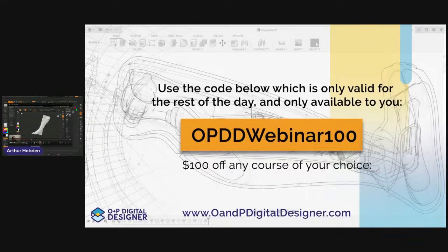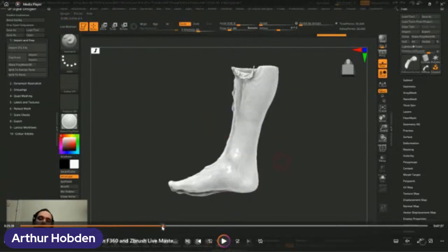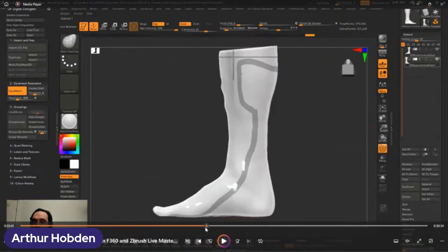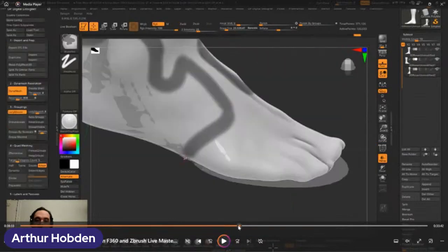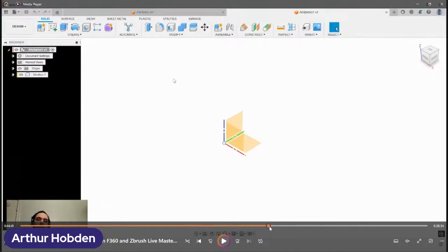Left before. So I'm going to go back to ZBrush. Just again, to recap what we had done last week. Last week we did some scan cleaning from an uncorrected, unaligned scan. We modified the topology and we got ourselves some trim lines in ZBrush. Those trim lines in turn were turned into quad meshes, and those quad meshes were the secret sauce for getting a scan and preparing it for CAD applications inside of Fusion 360.